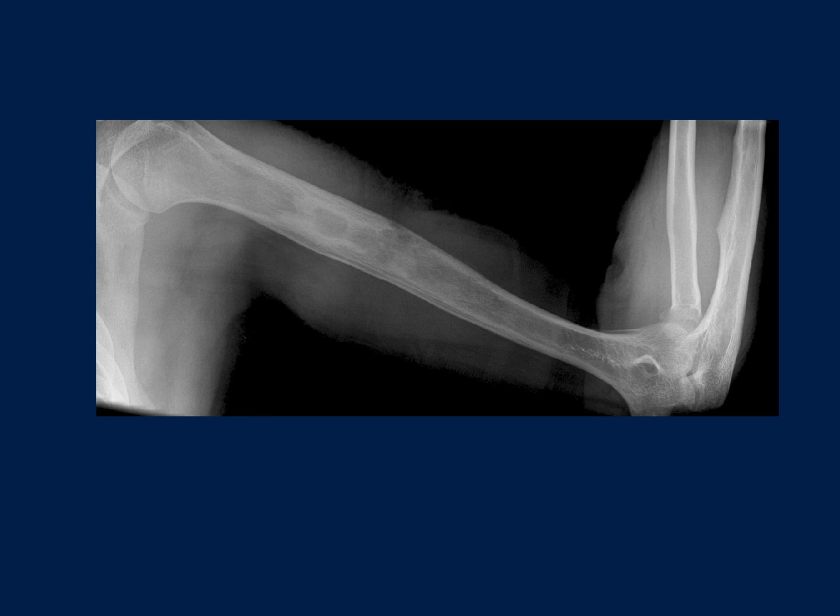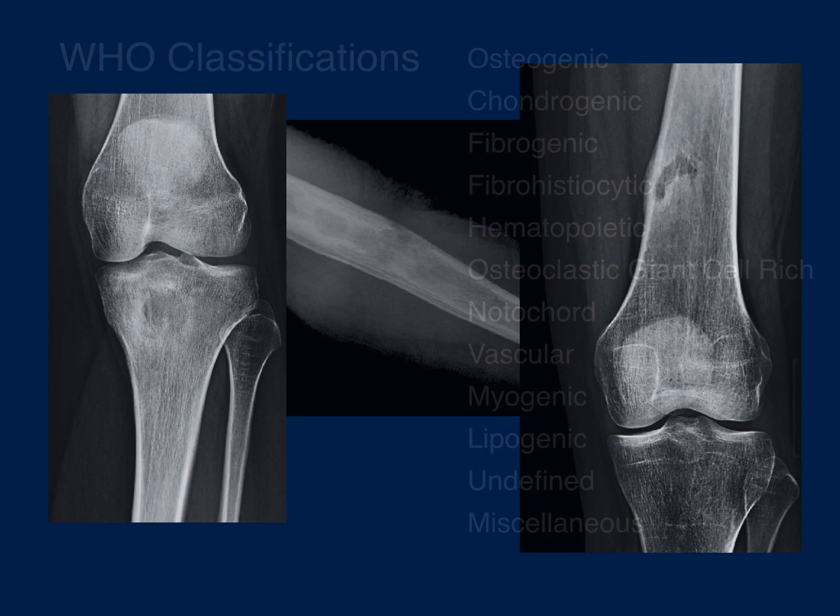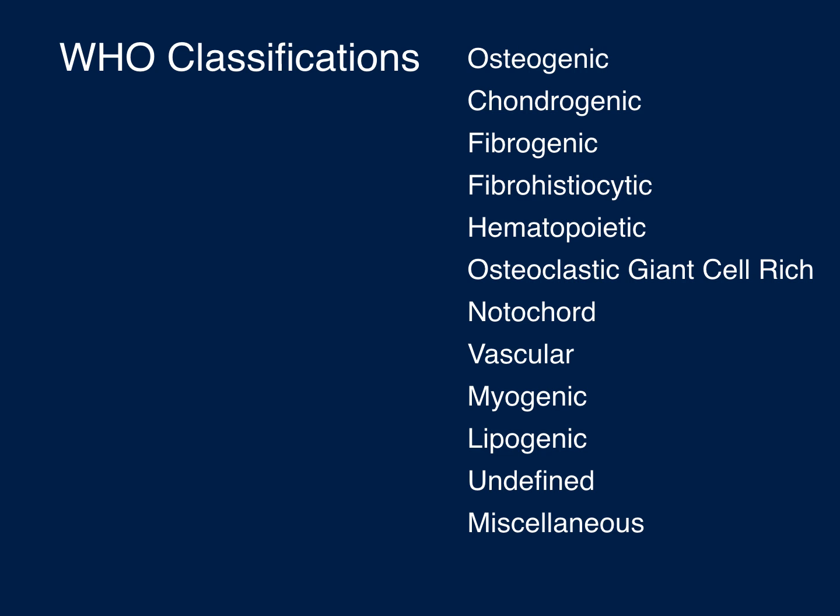And here are some more examples of the various appearances of infections. And that concludes the overview of the World Health Organization classifications of bone tumors.